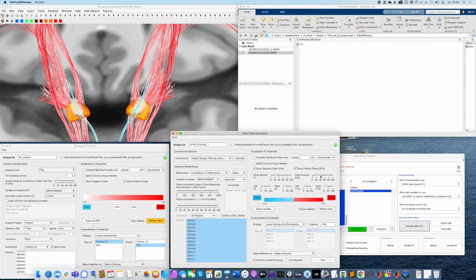The other sliders here are pretty straightforward. So what we see is that there were 2,514 fiber tracts that had a positive R value, 444 with a negative one. From these, we're currently showing around 20%, which amounts to 244 of these.